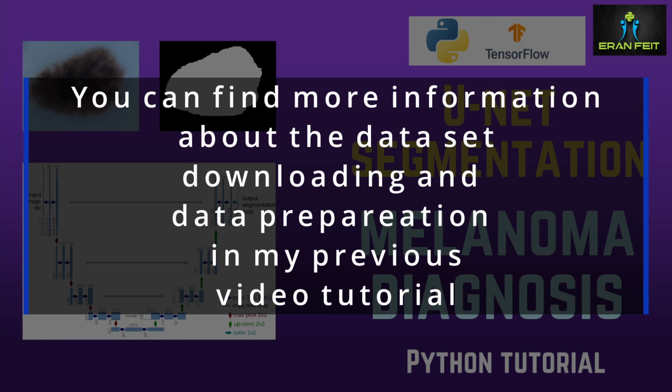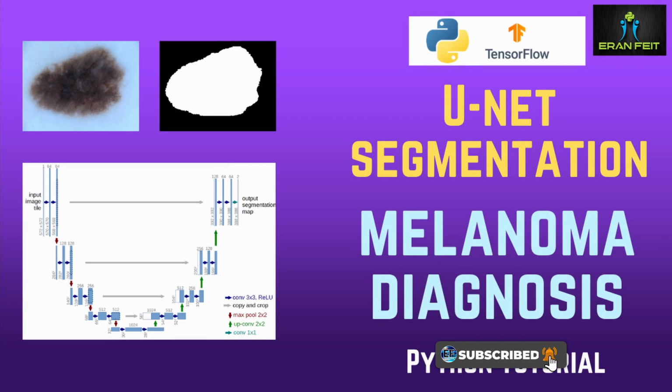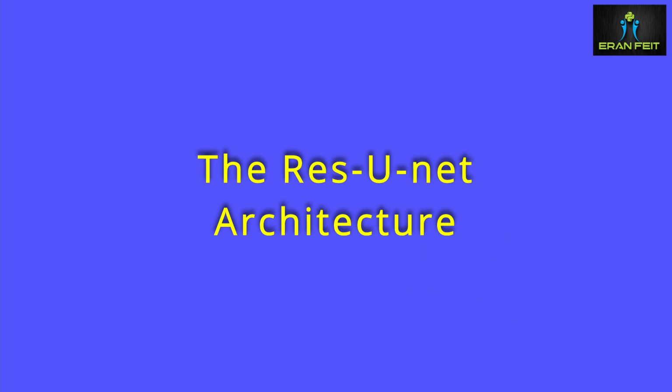The first phase of this tutorial, which is download the data and prepare it for the model, was done in my previous tutorial. You can find it here. I will leave a link. So I'm going to jump directly to the next phase, which is explaining what the Res-UNet architecture is.